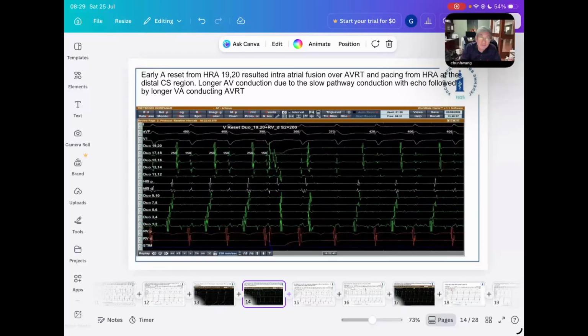No, I know what you're trying to tell me, but if you look at the septal A, the His A, during the S2 from the A, the polarity changes. Do you see it? During the tachycardia, the His proximal was initially negative, and when you pace S2 during the tachycardia it became positive. Yes, the His A changed. So this is not a fusion.